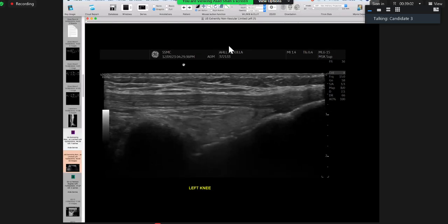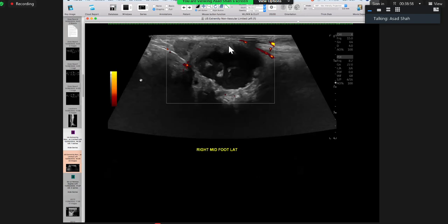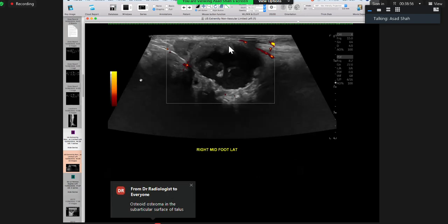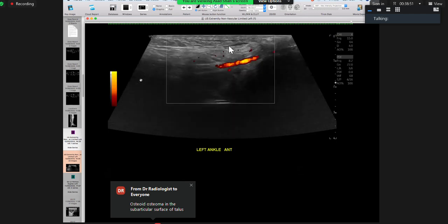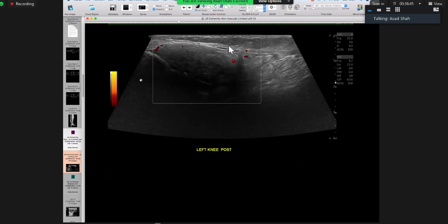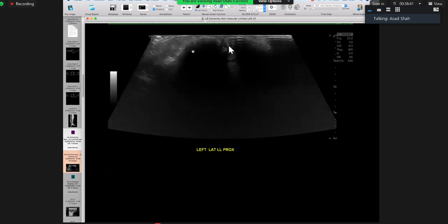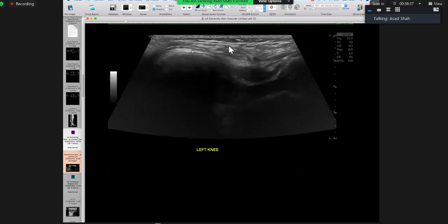Okay. Let me go up there. So that's the foot there, but the knee. Look at the left knee there. I want to show you. I mean, the thing is, when you got these big chunks there, you see that? Yeah. It's like I think posteriorly. Yes. I want to show you the superficial approach if I can. So yeah, this one kind of.